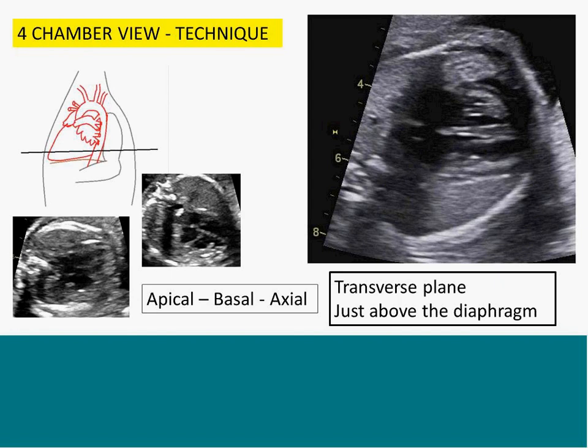When you're trying to see the interventricular septum, false defects in the ventricular septum are more common when the IVS is in a particular way. And if you see VSDs, it's always important for you to confirm it in another type of four-chamber view.